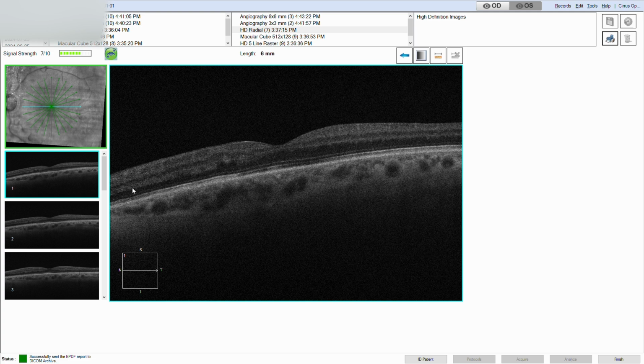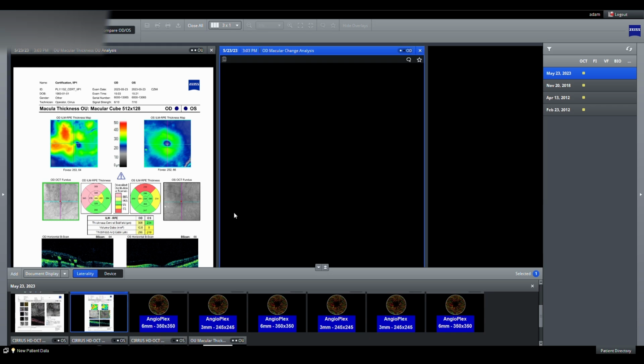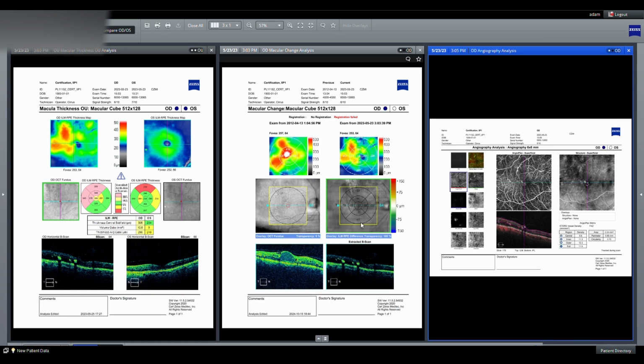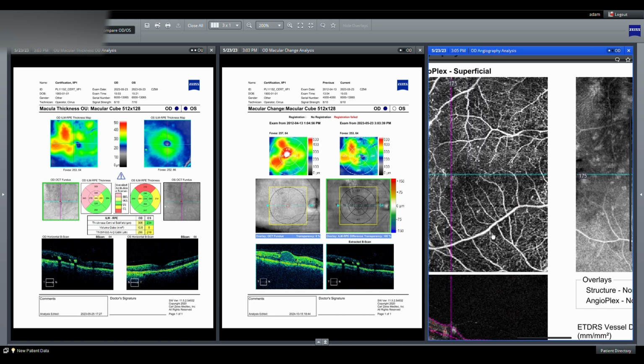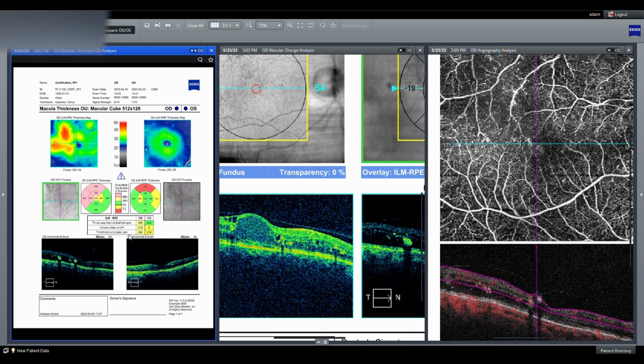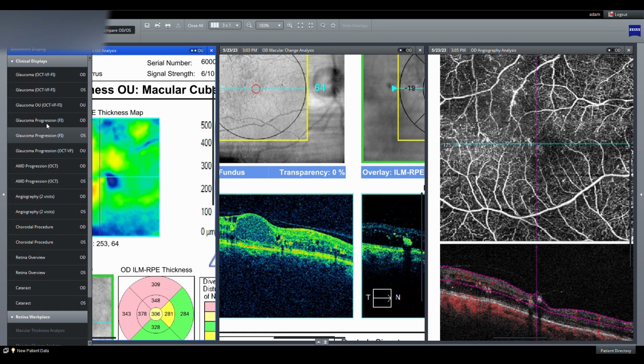And here you can print the PDFs, you can save them as PDFs, or you can export the PDFs as DICOM, and then you will have the same printout that you get on paper within Forum. And this is basically what I'm talking about. After we've exported them as DICOMs, you can see them in documents as basically PDF printouts. And this applies to all modalities, whether it's OCT angiography, the macular cube, or rasters, or from other machines like the fundus camera or autorefractometer.